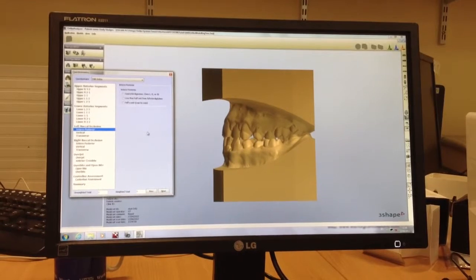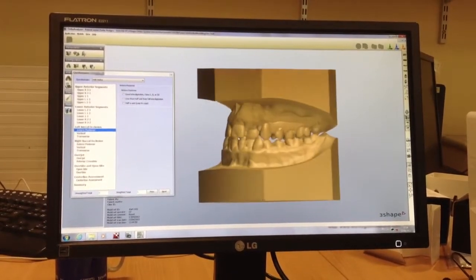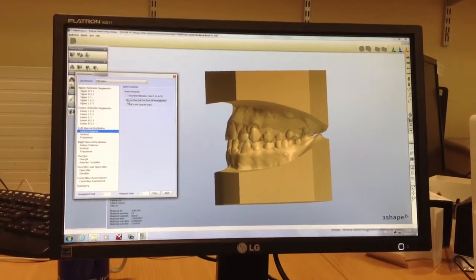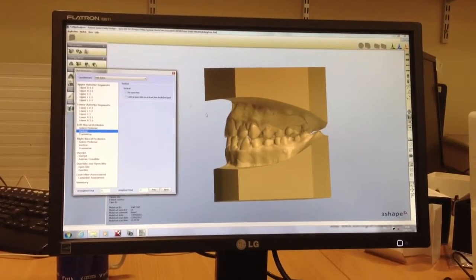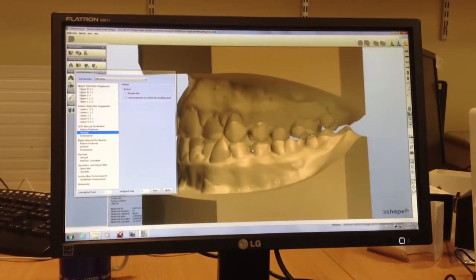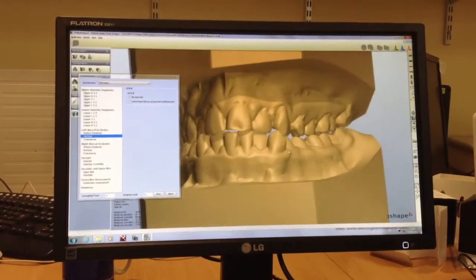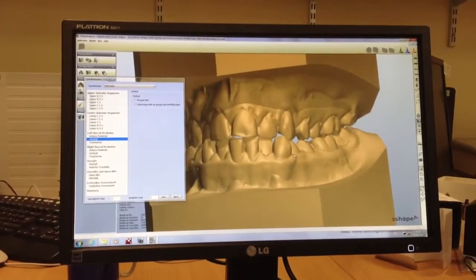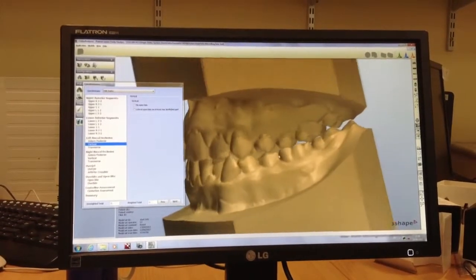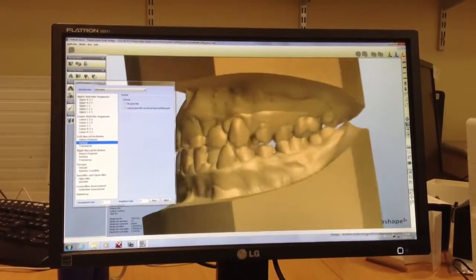And then looking at the buccal occlusion on the left hand side, looking for the interdigitation, less than half a unit. Vertical open bite, so open bite is classed by about 2 millimeters, isn't it? 2 teeth at 2 millimeters each, yeah. So we certainly consider that to be 2 millimeters, and it's kind of touch and go. What would you say there? Would you give it?